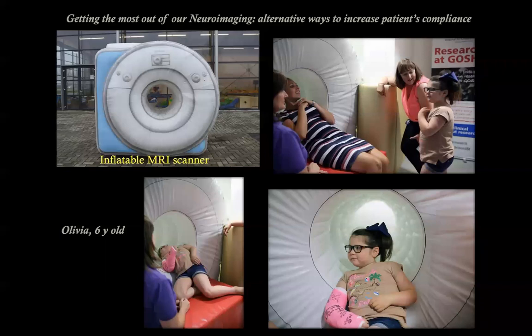And like that, we are trying to reduce our sedation rate, trying to train the children in staying very still. But remember, the point is to have a perfect scan because we are looking for very subtle abnormalities. And this is just another example.